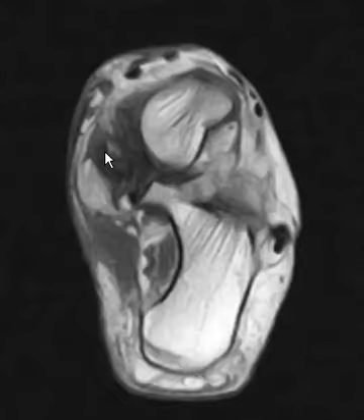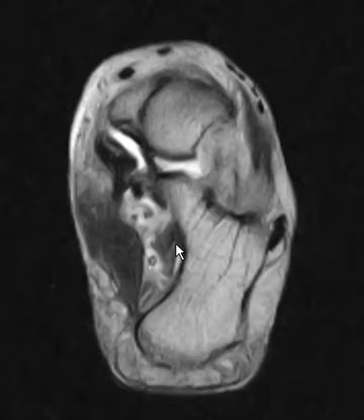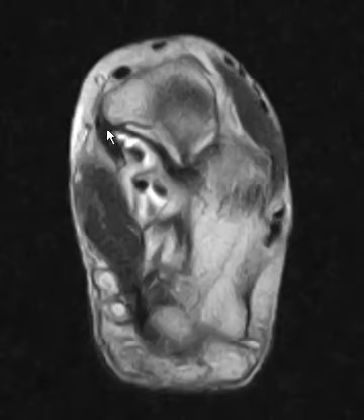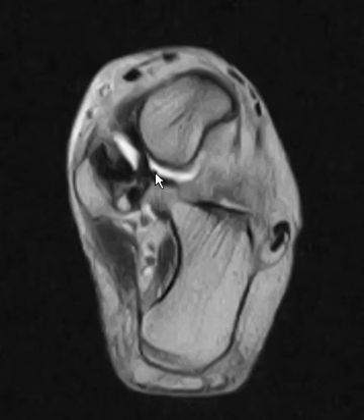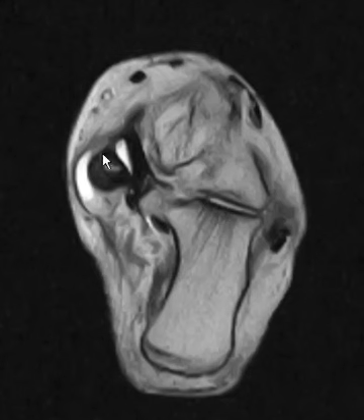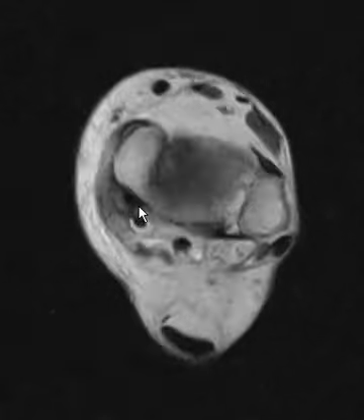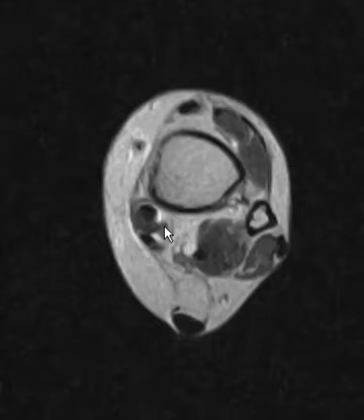So the question is, is this a hypertrophic tear or hypertrophic tendinopathy? And if we put up the T2 weighted images, we're going to look at this attachment. Here's the navicular bone. We can see continuity here is coming off, going up, up. Things usually look a lot better on the T2 weighted images than T1 weighted images. And we can see this nice dark band, so it's not ruptured, it's just enlarged and has lots of increased signal within it. So this is what we call severe hypertrophic tendinopathy.